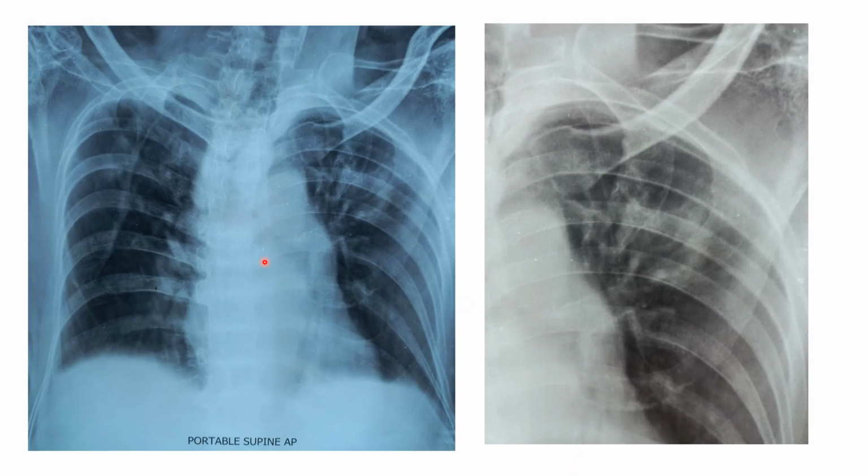Now sometimes a cavity can be quite small. If we focus on this area, there is this cavity with surrounding consolidation. Usually the cavity will become very obvious when you see the surrounding consolidation. If some sort of whiteness is there, and in the center of that there is a dark area, then that is the cavity. So here is the cavity with the surrounding consolidation.